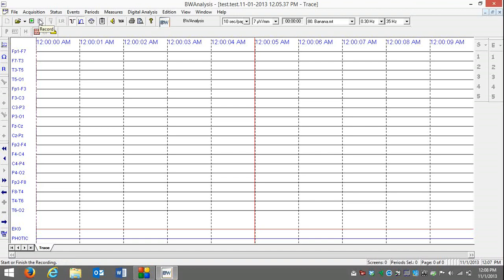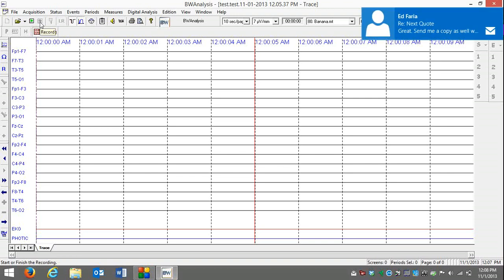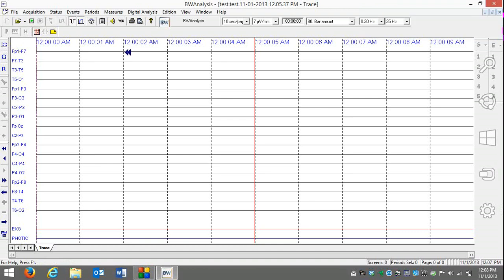So we have the start is your non-record mode. So green start button and then record button. Okay. And the record button allows you to start the recording. Okay. We also have a live review button. This is our look back feature. It allows us to go back and view what we've recorded during the live recording.